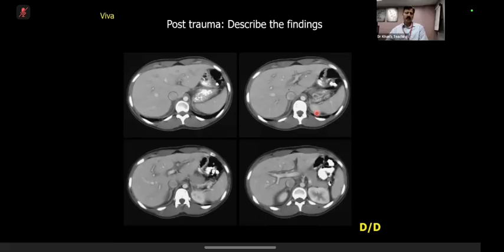Right. So the basic idea is that, arterial and venous system, of course, that's not the issue in this case. The issue was just to develop your eyes on this finding, which is what we call periportal edema. Now, sometimes what I have seen is that inexperienced ST2s, let's say, at times they confuse this finding and they think that this is intrahepatic biliary channel dilatation.